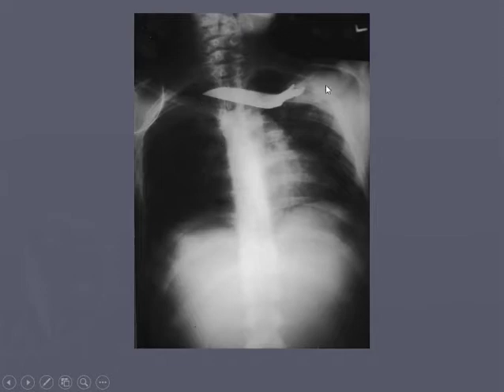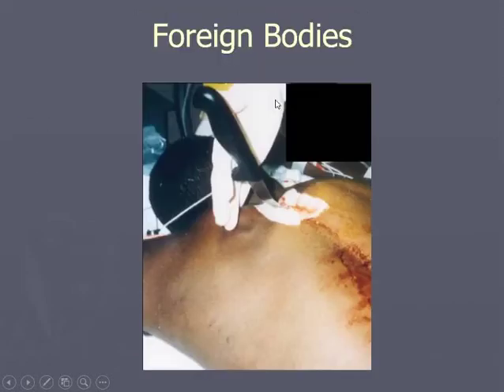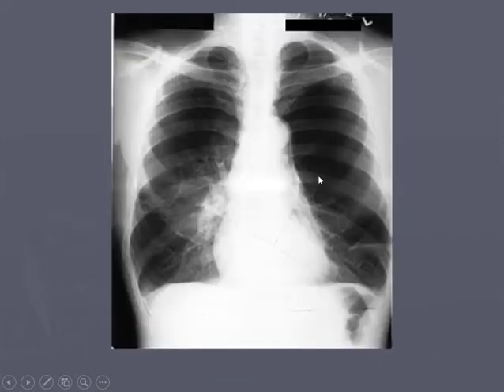You can think in your mind that, oh, he's skewered. It's cut his spinal cord. No, it hasn't. Actually, with this gentleman, if you look, the blade is bent. So when it went in, it hit his spinal processes and just skewered right along the tissue of it, the adipose tissue of his back. They didn't really penetrate anything.